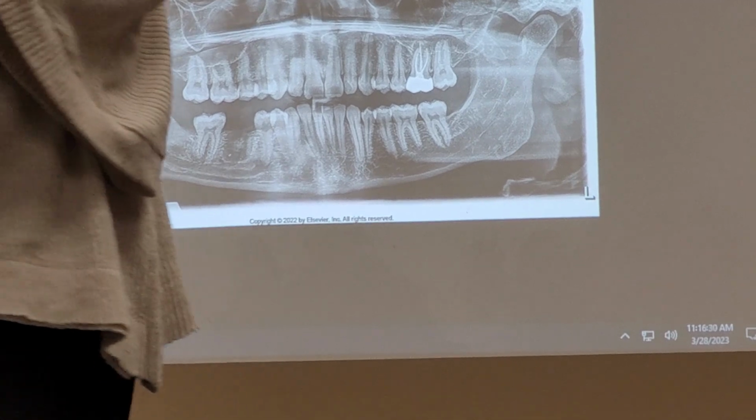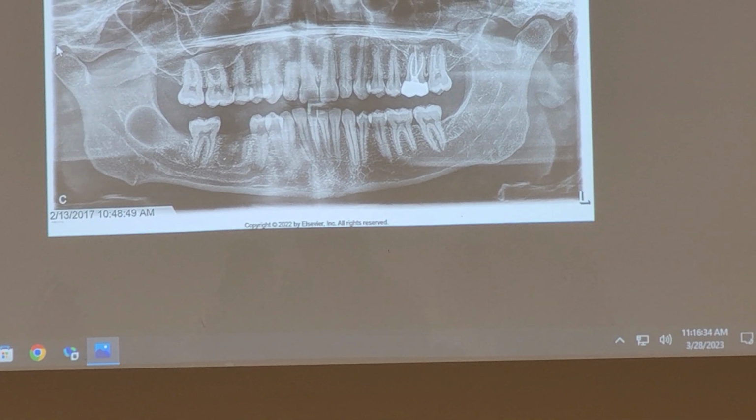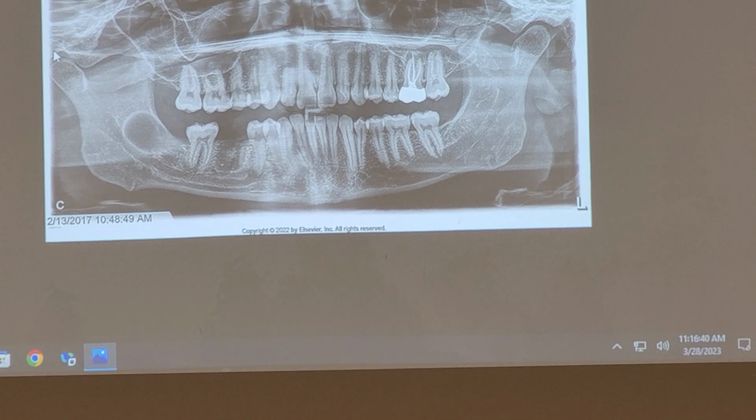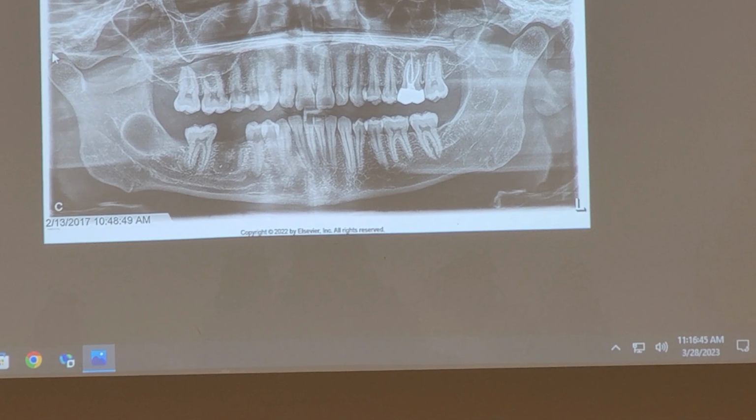Written in my notes as radiopaque for both the unilocular and the target lesion. Talk me through this. So it's radiolucent in the middle and is surrounded by a halo of radiopacity. Point to it. Let me see. I want you to point to it.